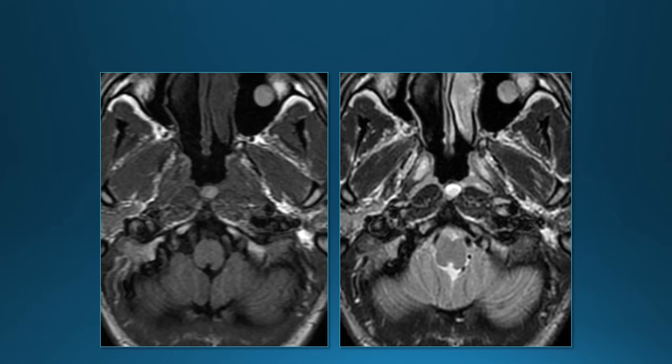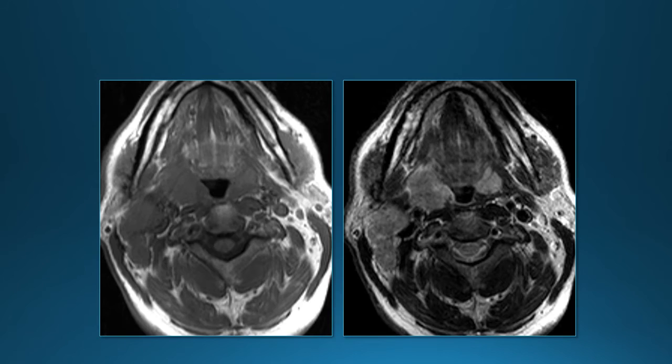This is a midline lesion in the nasopharynx, very characteristic for a Tornwaldt cyst. This patient has a mass in the tonsillar region and enlarged lymph nodes. This is typical in a patient with squamous cell cancer of the tonsil.